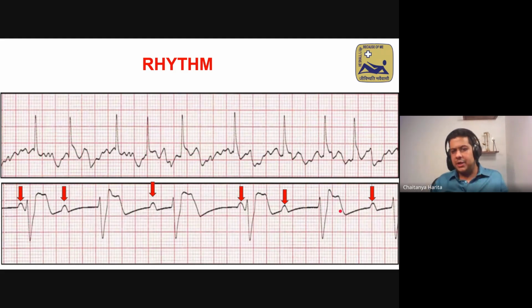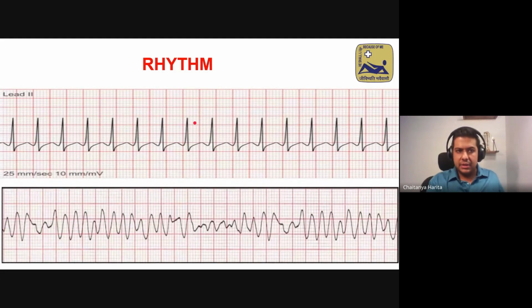So when you look at this, you mention P and QRS are not occurring in synchrony. This means the patient is not in sinus rhythm. And this is very, very important. You look at this particular ECG that I've shown. The bottom one just looks like a child has scribbled on a piece of paper, or in some cases, some adults like myself whose handwriting hasn't evolved over the years, my handwriting tends to look like this.